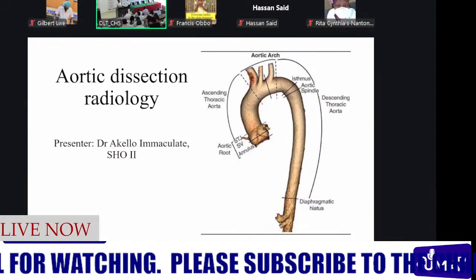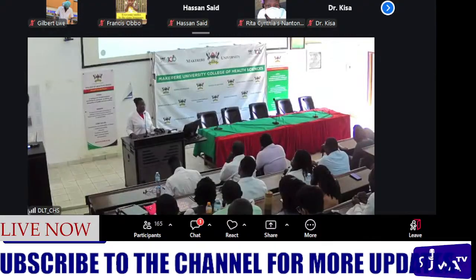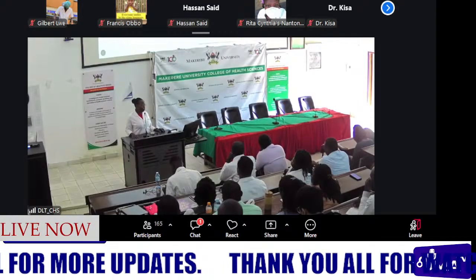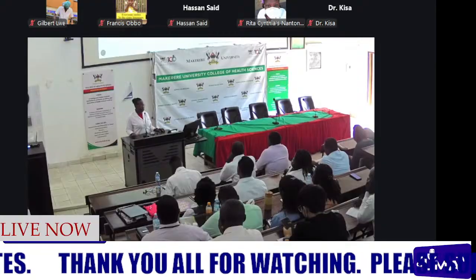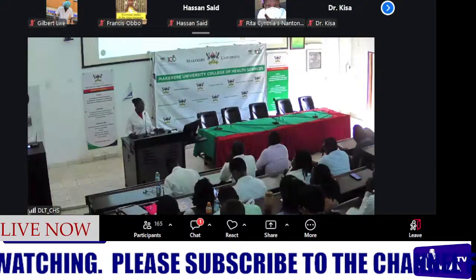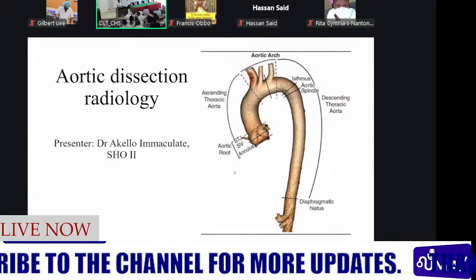Because the timing was for the pulmonary arteries, and they are the ones that had really good contrast opacification, our aorta wasn't really well opacified. And also, with the acquisition, we were not able to capture the whole length of the aorta and its branches. For a CT aortogram, we expect to capture from above the aortic arch, and we go as far as the femoral arteries distally. And for this one, it was a CTPA, so we just ended at the mid-abdominal aorta.